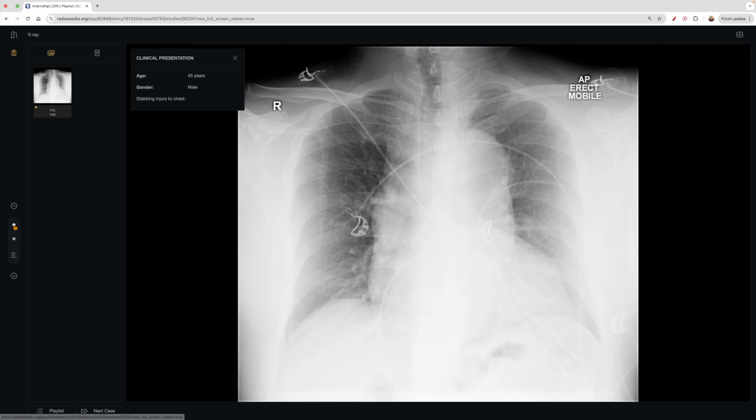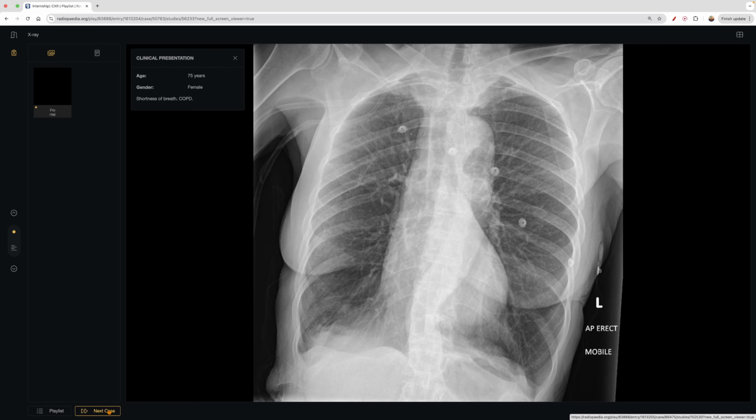Now, in terms of clinical utility, not really much because it's not as common to see. In terms of the boarding exams, this comes up like bread and butter all the time. They want you to know it. So just keep in mind when you see a widened mediastinum and the patient's decompensating or had some kind of crazy accident, that this should be something you think about.